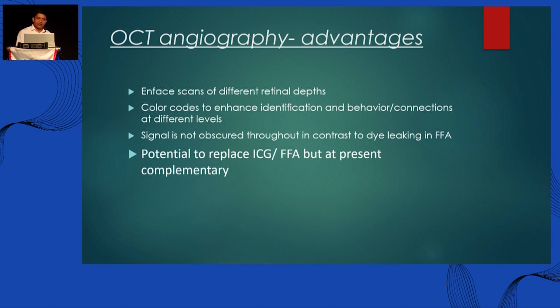Neither fluorescein nor ICG will be able to show that. It's non-invasive, so you can do both eyes at different times, so there's no issue with the time.